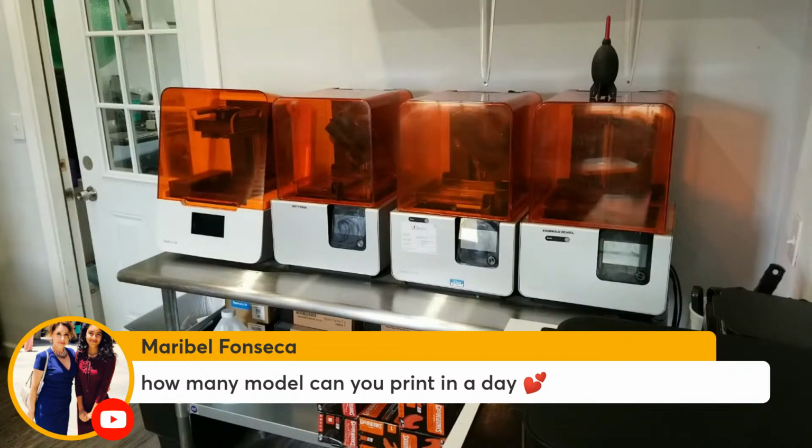So I can do 18 models at a go, and I can probably do that twice a day easily. So whatever math that is, 18 times 2. So I can print that pretty easy, and then I can print overnight also. So that's another 18 that I can print overnight.